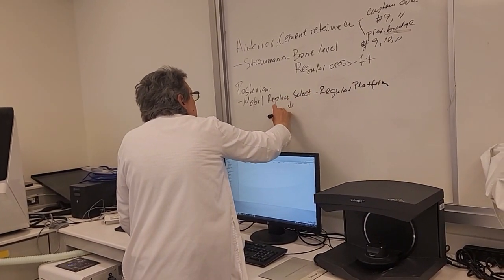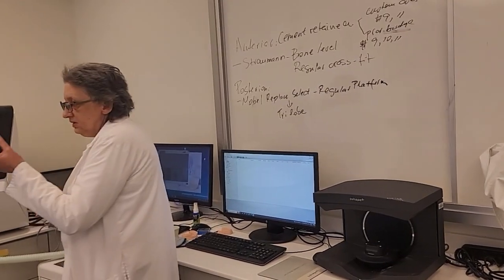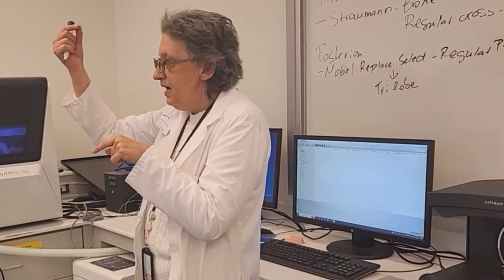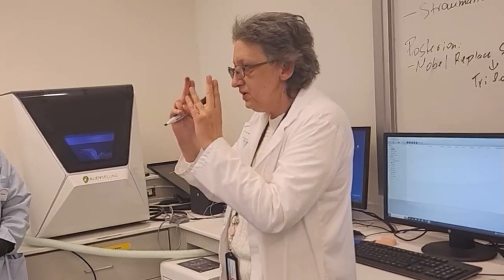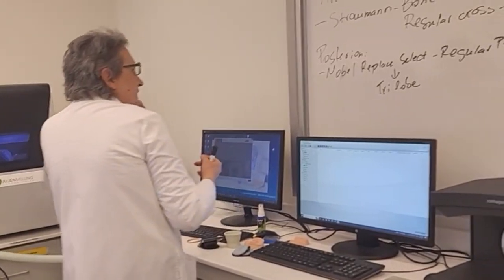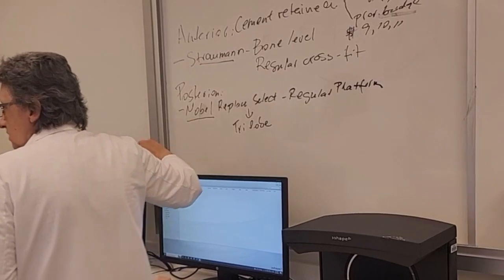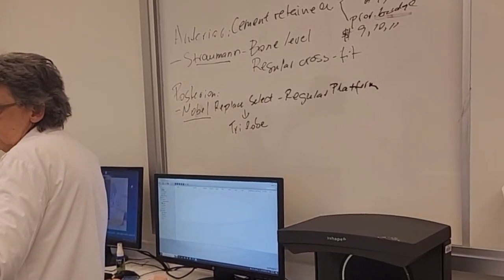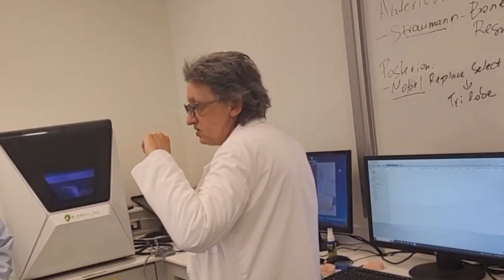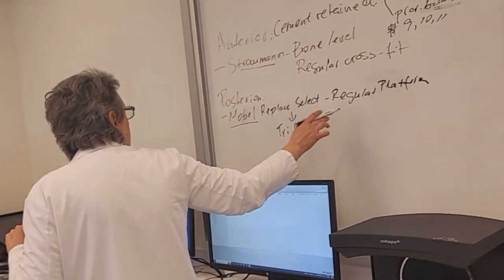This is also called a three-lobe system, because if you look at the inside design of the implant, it has 3 notches, and the tie base has 3 prongs that lock into the implant itself. So again, we're using a different implant company, Nobel, which is one of the largest, and they were the initial ones that started with this screw-like implant. And we're using Replace Select regular platform.